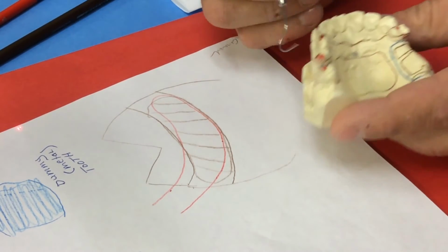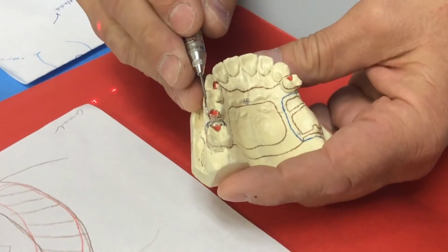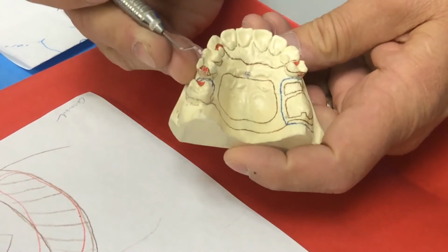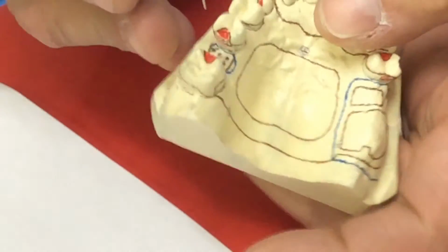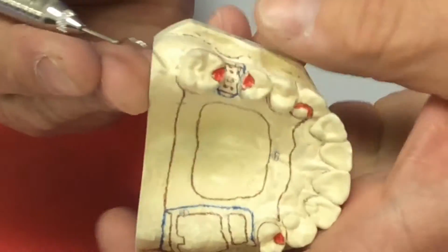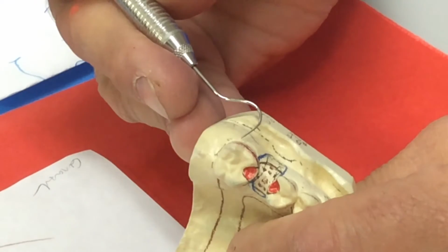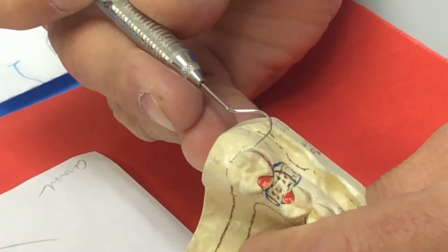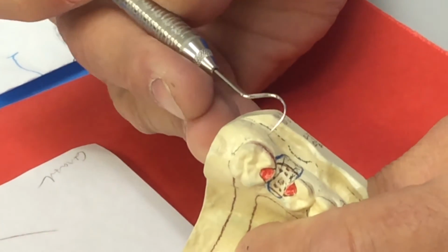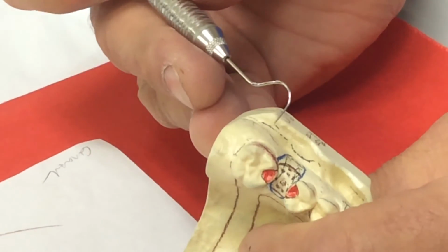So if I continue on with this design, my plate comes around, I'm going to come up and into my rest. Therefore, my metal is now encompassing the guide plate. I'm going to drop down. I'm going to put my retentive arm out here. I've got a difference in retentive arms. When you're using a circumferential clasp, my undercut is marked here, and it goes at the bottom, the inferior part of the clasp.